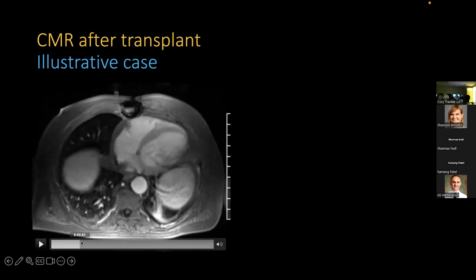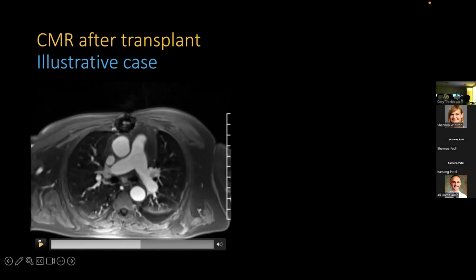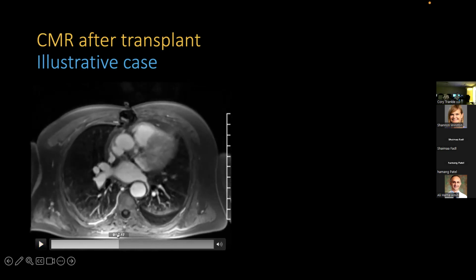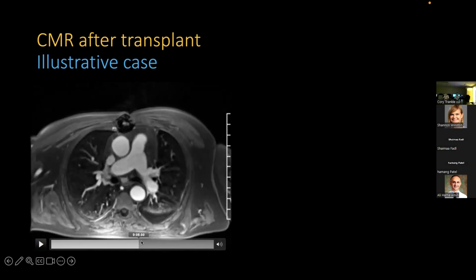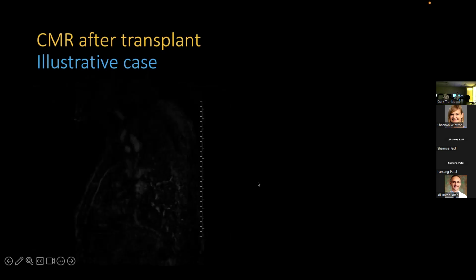And this is a post-contrast T1 VIBE. And again, it shows that focal outpouch. And it is near the anastomotic site. Like this is the waist-like appearance of the anastomotic site, and below it is the focal outpouch.